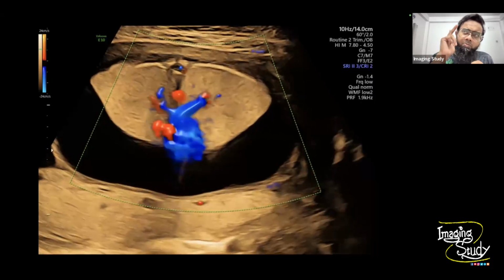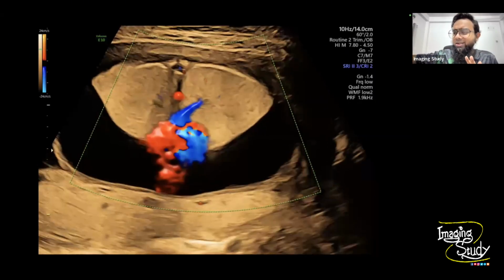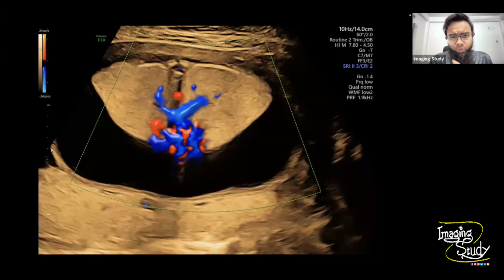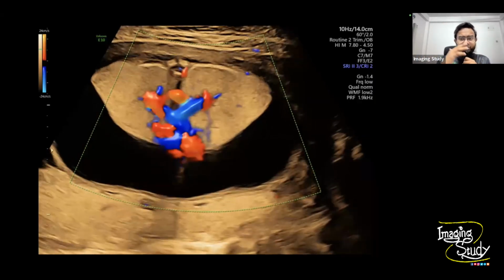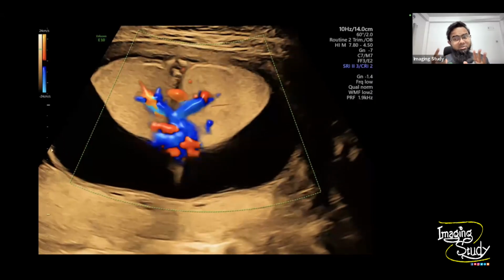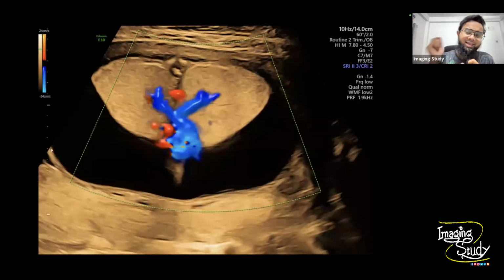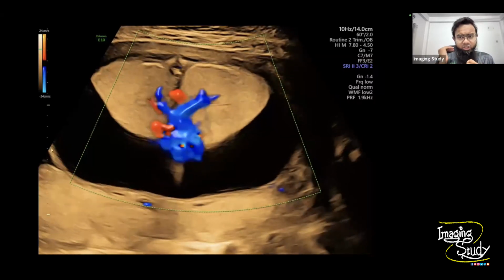So if you block the principal bronchus of the right lung, the right lung will get enlarged and echogenic. If you obstruct at the laryngeal level, larynx or trachea, then both lungs will get enlarged and echogenic. What happened in this case? So this is a high obstruction.